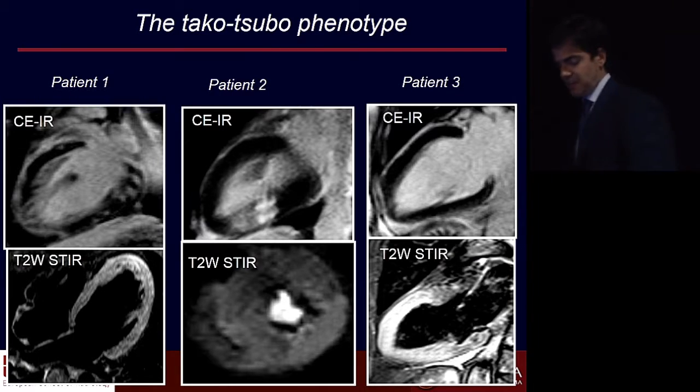So let's see, how would you approach this case? Do you think it is an ischemic edema? Would you say it is an ischemic edema? The number 3. It's not ischemic. Why? It is transmural, but it is involving segments with different coronary supply. So either this patient has a 3-vessel disease or there is something different.